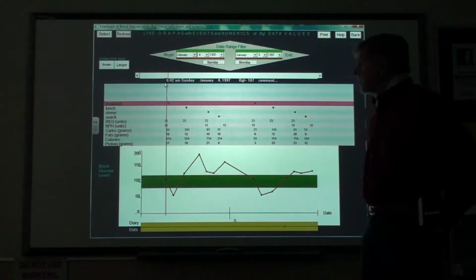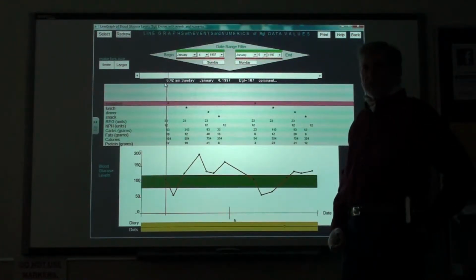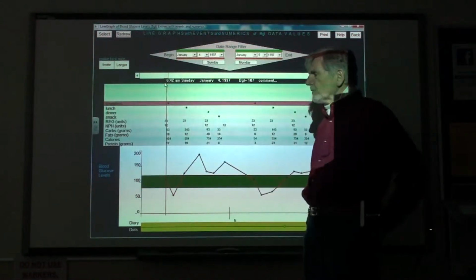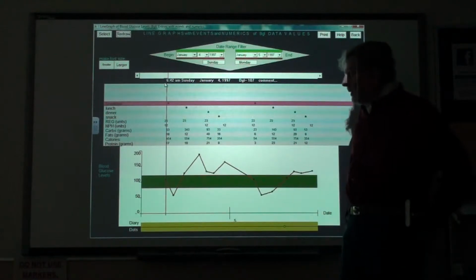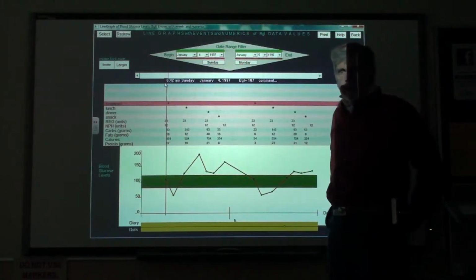It is important that you enter these 4 food items at these times that you need to make some kind of adjustment. Your carbs, your fats, your calories, and your proteins. These are entered along with a reading just for this particular analysis.